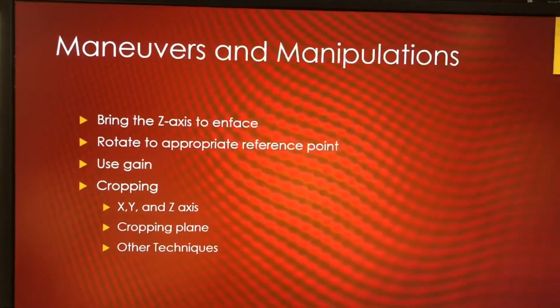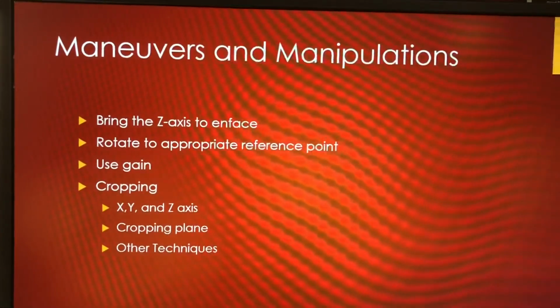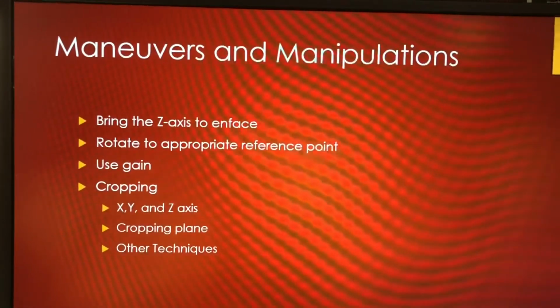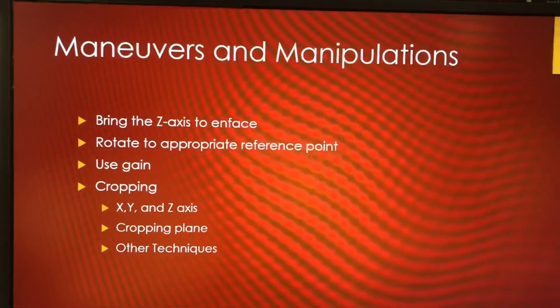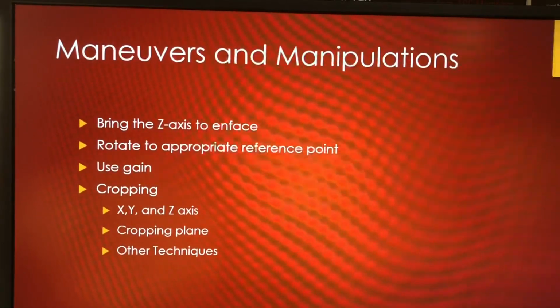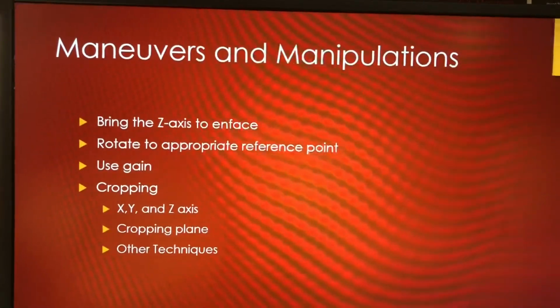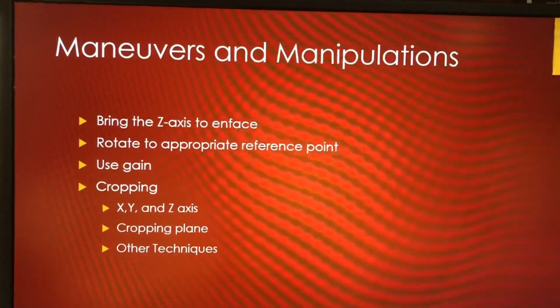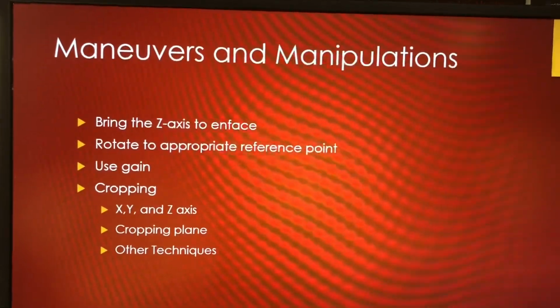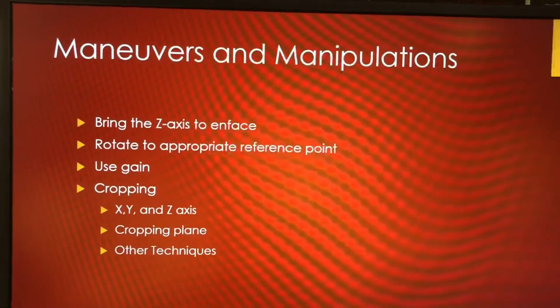This is one we typically use. There are 2 variations on that. There's the one with the plane, so it looks purple, which gives you an idea of a frame of reference to where you're changing the volume and cropping different information away. And then we also have what's called a face view, which is like an invisible plane. So we just operate changing the plane to cut away and bring back the different information.